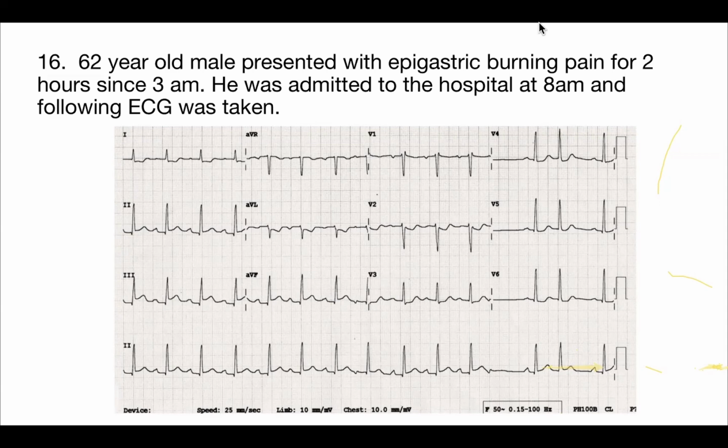Very good. So there are ST elevation. Remember 2, 3, AVF, even 1 millimeter is enough for us to tell that there's ST elevations. What else? Yeah, very good. So there are reciprocal AVL ST depressions as well as some V2, V3 area also ST depressions, right? And if you see the rhythm strip, there's a blocked P wave, right? Okay.